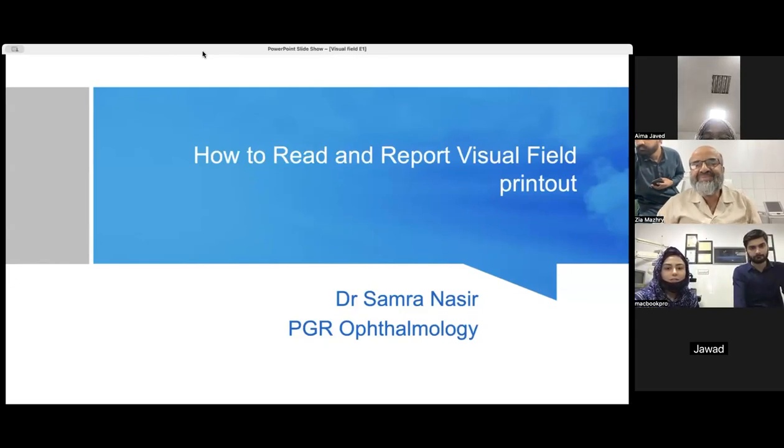Samra, resident ophthalmology. I will be discussing how to read and report visual field printout.